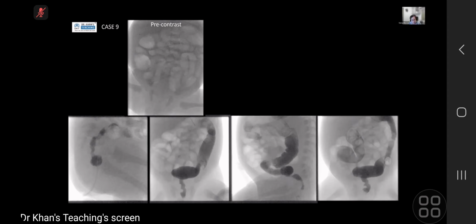Okay, so I think what this image shows is one of the ones that you mentioned earlier, Hirschsprung's disease. I thought I would stop and mention the reason why. In Hirschsprung's disease, the main thing you're looking for is your rectosigmoid junction. So how do I tell what's rectum and sigmoid? I often use essentially your sacrum. If you are looking at this, that's probably the area of your sacrum. So that's your rectum, and whatever is anterior to it, or above it, would be your sigmoid colon. So it's important to do this without a balloon.